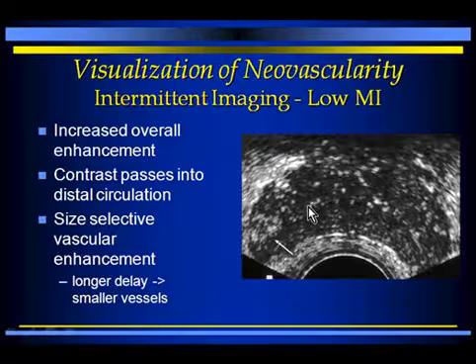So there are multiple different ways of visualizing ultrasound contrast agents. I'll show you in a little bit some of the color and power Doppler methods, but we actually prefer to use some of the grayscale methods. The grayscale methods use harmonic imaging, as we just talked about, so you can distinguish what's coming from the contrast by the frequency of the sound that's returning. There are different ways of doing that harmonic imaging, but basically, once we have the grayscale image, we see the areas of increased vascularity as brighter because the contrast agent tends to cause increased reflectivity.